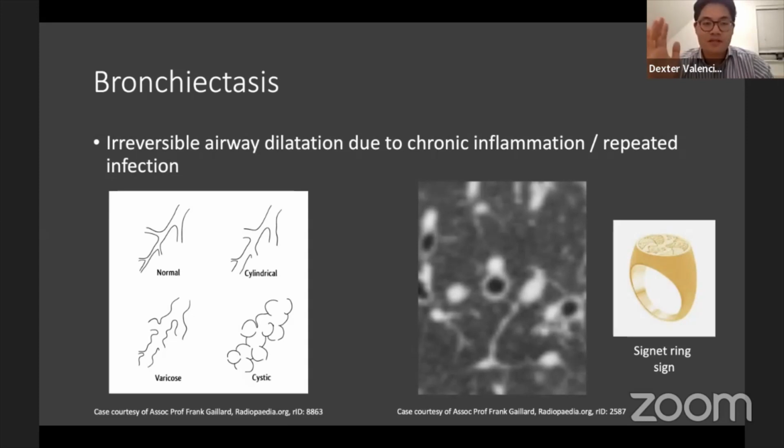It really depends on the clinical context. If someone's swallowed a foreign body that they can get out manually, obviously a CT will be very helpful if you can't see it on the chest X-ray. But in most of the cases that I see in hospital, these are going to be patients who have had strokes, have been unconscious, and they've aspirated a bit of food or gastric contents into their right lung. So that's what I was talking about before.